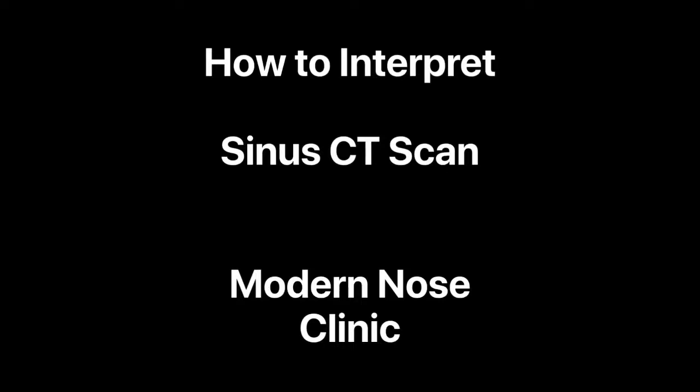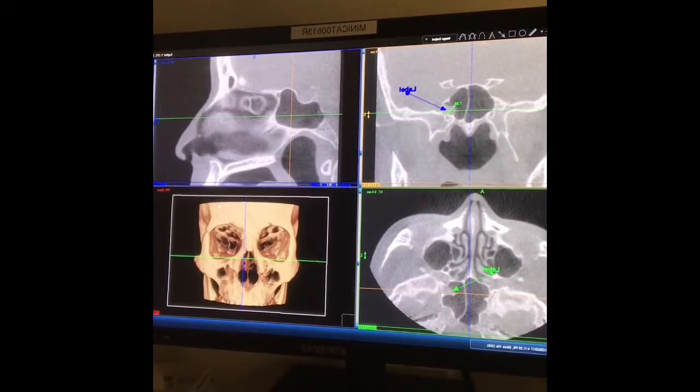We're excited to offer you a high-definition, three-dimensional CT scan of your sinuses today. This will answer so many questions. And here's a CT scan. This is a CT scan of my lovely wife, Dr. Lee Scarata. So we see down here that this is a three-dimensional image of your skull.